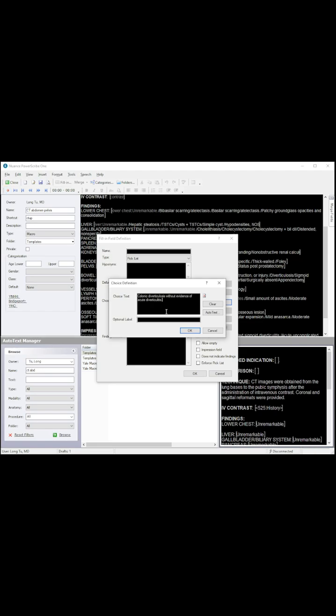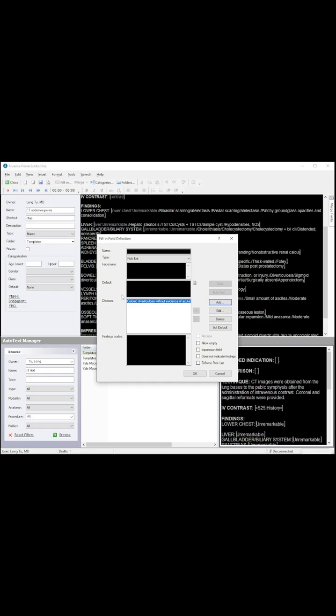this system can be very odd sometimes. Sometimes I even type because of this wonkiness. I don't know if that's our system or everyone, but I just hit OK. So now we've got that pick list option.